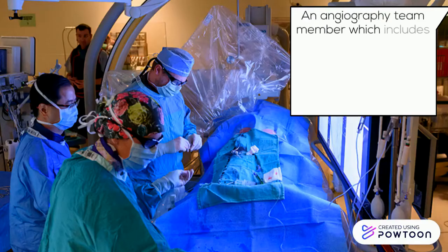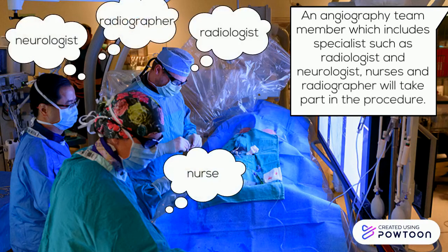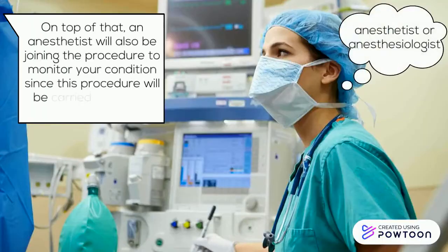An angiography team member, which includes specialists such as radiologist and neurologist, nurses and radiographer, will take part in the procedure. On top of that, an anesthetist will also be joining the procedure to monitor your condition, since this procedure will be carried out under general anesthesia.